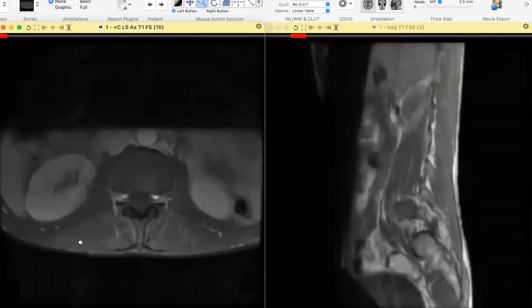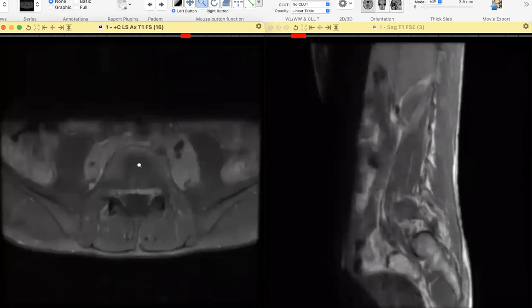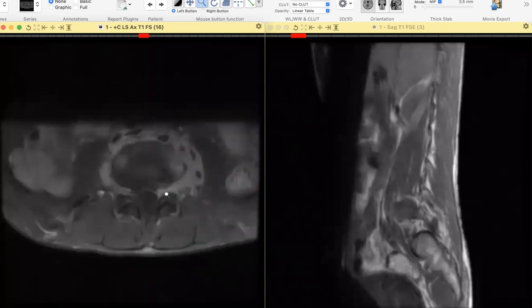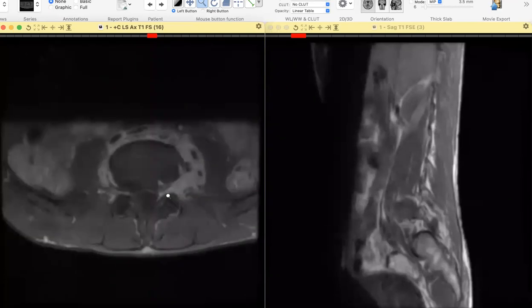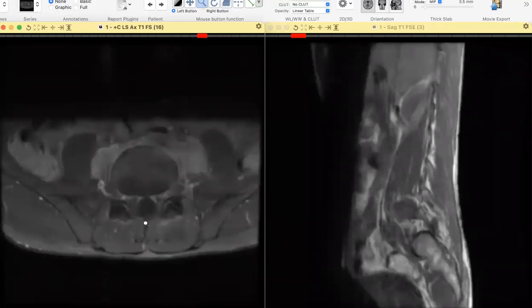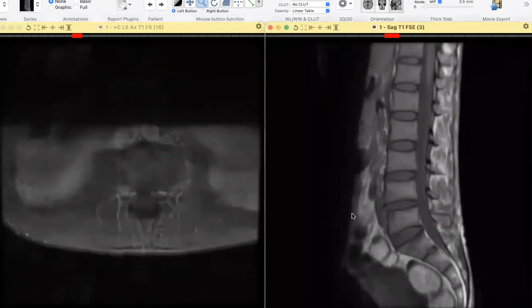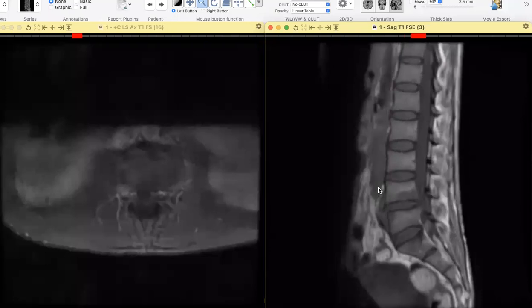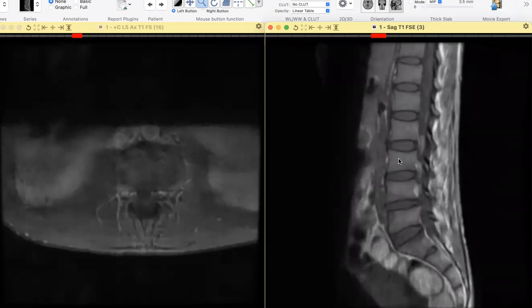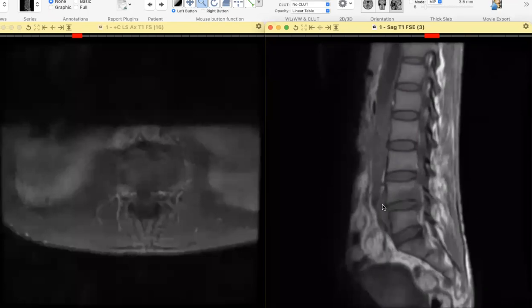So on the post-contrast images, it's much more obvious. There is paravertebral abscess and spondylitis, which is extending into the intervertebral space, intervertebral foramen. And at the moment, there's no compromise of the spinal canal itself, but the nerve might be impinged in this area. Rather than saying LV, say lumbar, because that is the more common term. I mean, with us, you can say anything, but the fourth lumbar vertebra or the third lumbar vertebra would be a better way.